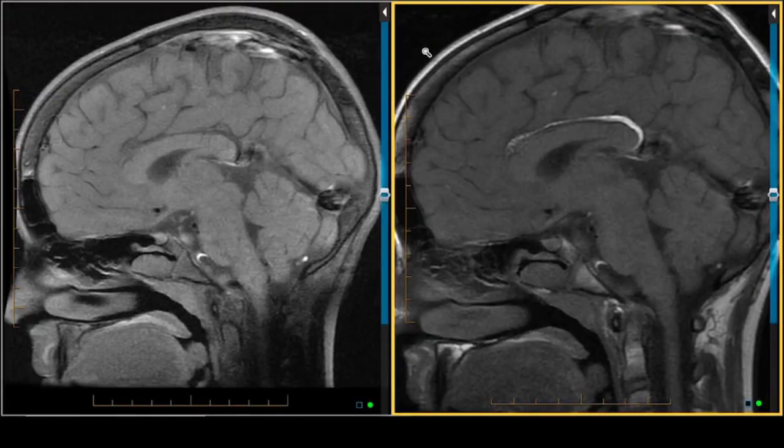This is likely a lipoma of the corpus callosum, but to confirm what it is, we use fat-suppressed imaging, where we keep all other parameters identical, and we see that this bright signal on T1 weighted imaging goes away. This confirms that it's a lipoma, that it's just fat. An intracranial lipoma is often in the midline. Along the superior margin of the corpus callosum is one of the most common places. It's considered to be an incidental finding.